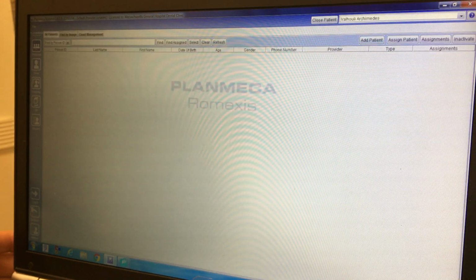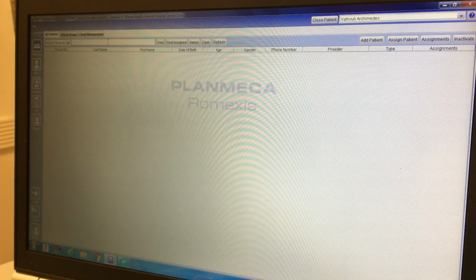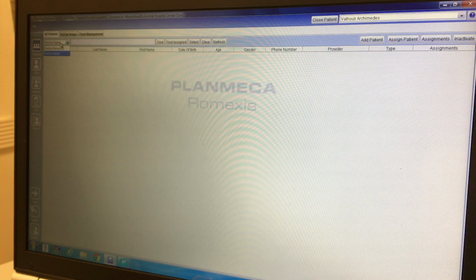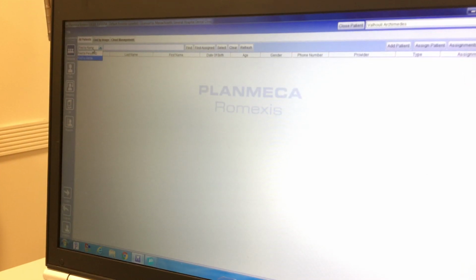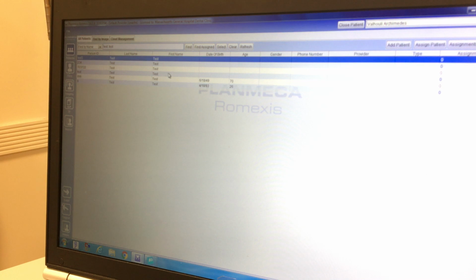Okay, and what you want to do is, most of the time your patient will not be in Romexis, so you find your patients first. You can find them by name or ID, MRN number. So you want to go to find by name here. Last name first, so I'm gonna do test. Press enter, and then find to see if your patient is here or not.